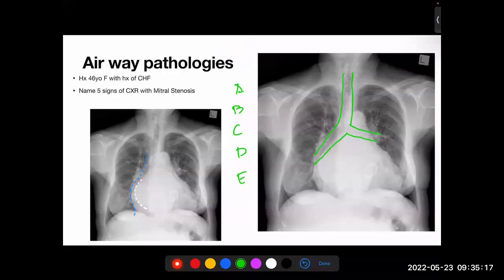So, for example, if you look at this heart, there's this thing they're demonstrating here. There's this cardiac shadow up here. There is a double cardiac shadow down here. So double cardiac shadow is one other thing. You can Google double cardiac shadow.